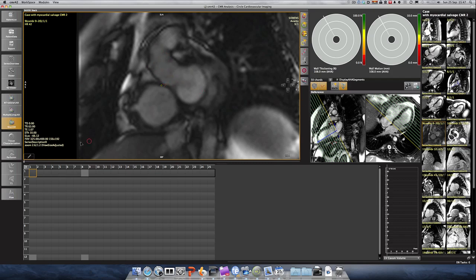should be included. So in a way, I would probably say endocardial contour, this is part of the RV. And RV shapes are different, so I may actually look at the end of the tutorial just to load a few other cines so that we can decide on what the best basal slice is. But here I would probably do this and not include this.